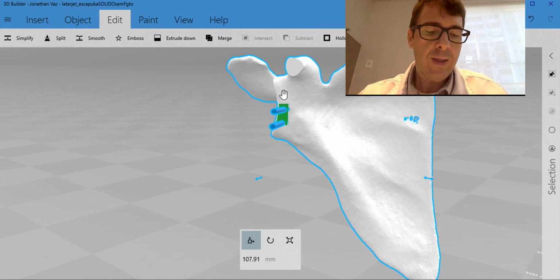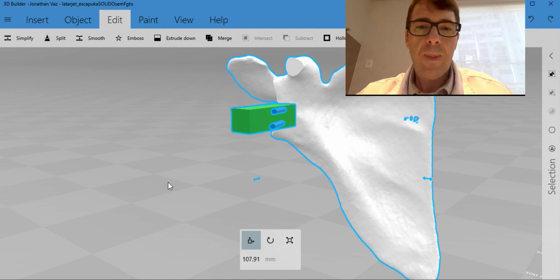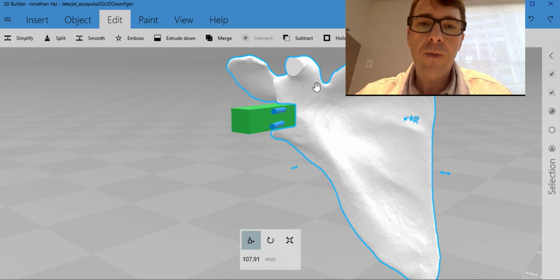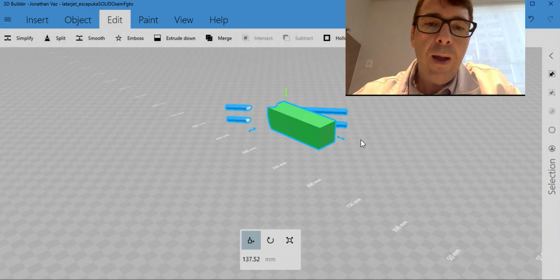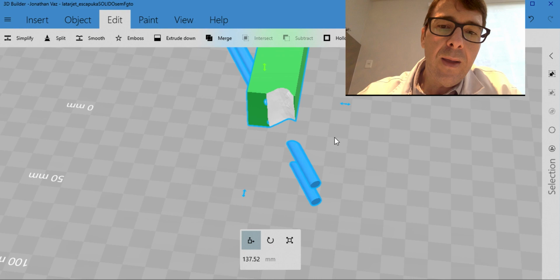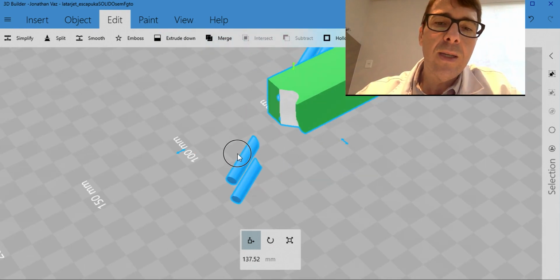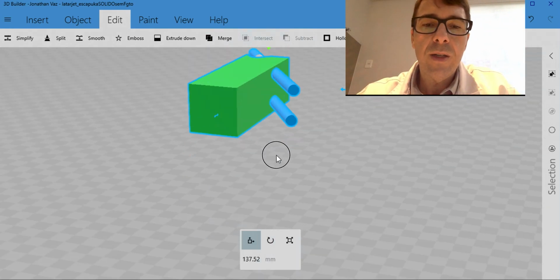That doesn't work. It didn't work well. Let's do it again. Let's select our object. Let's select our second object and subtract. Okay. Now here we can see that our guide was created having the location for the glenoid, and now we just need to do this with the screws, and we will have the screws location for the surgery.